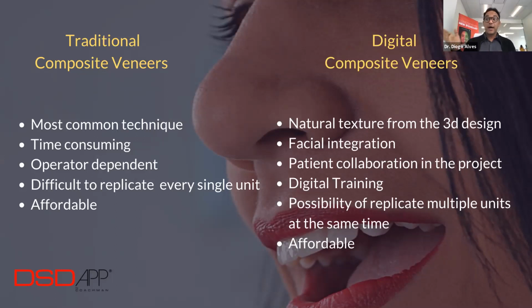Once you create your 3D design, the app will already generate an STL file that will allow you to create multiple units at the same time, so it cuts the time in half. All you have to do is understand the procedure and the technique. And of course, it is also an affordable alternative for your patient.